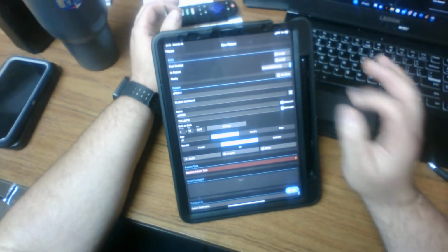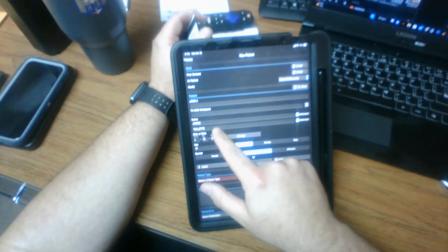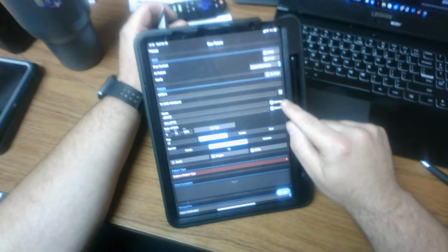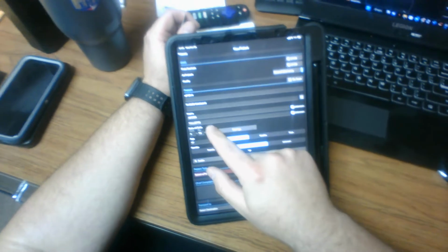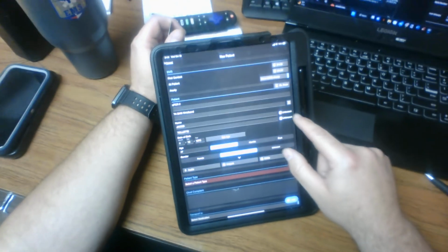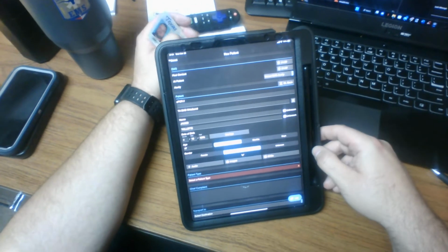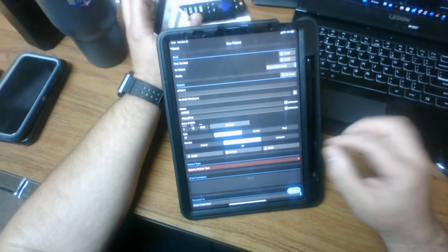Now, moving forward, if you're going to play around with this app, the very first thing you need to do once you've scanned anything is you need to change this name to test. Now, there's an unknown button over here in the side. From today on, if the hospital receives a name or what appears to be a legitimate name, or they receive an unknown name, they're going to consider that to be a live patient, and they think that you're coming in using this app. Now, that's why we change it to test. That's the only acceptable test patient we can enter.